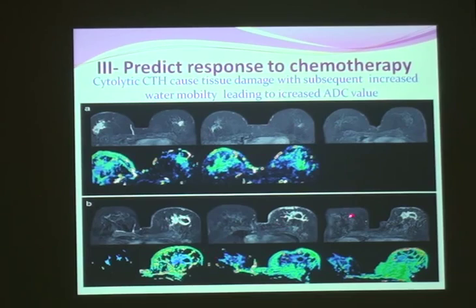There is much apoptosis here and cell death. I'm having good faith here. Unfortunately, in another example, I don't have much difference, less than 5% in the diffusion restriction. It wasn't responding to chemotherapy.